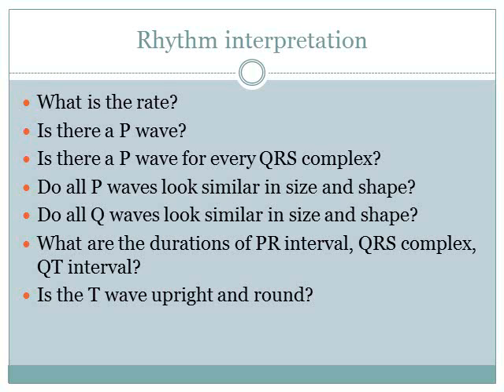Okay, the last topic I want to talk about here is rhythm interpretation. Again, I'm not going to go into the abnormal rhythms in this tutorial. We are just touching the basics. I'll tell you how to do the interpretation and show you a normal rhythm, and in a next tutorial I'll show you how to do the abnormal rhythms. So what do we need? We first need to know the rate. We already covered that topic, so now you know how to calculate the rate from an ECG strip.